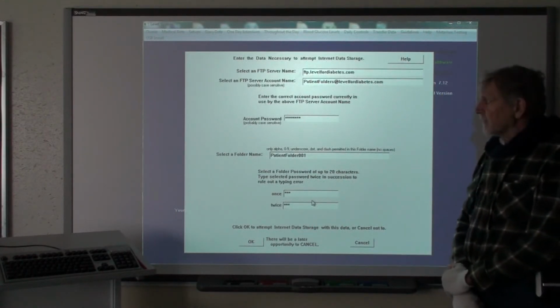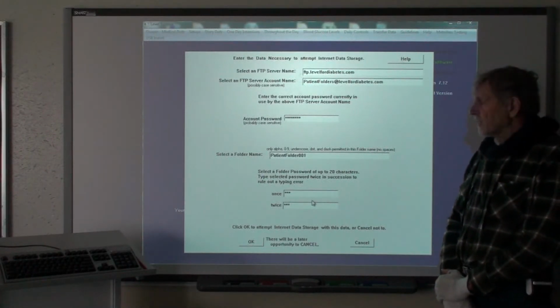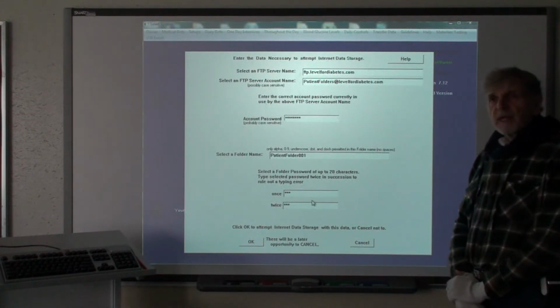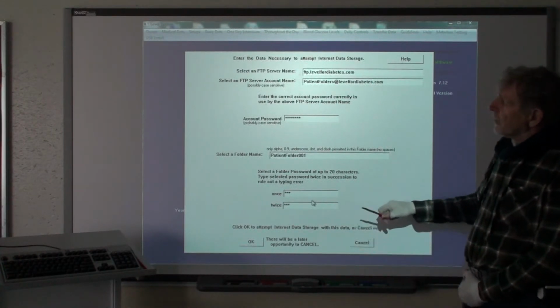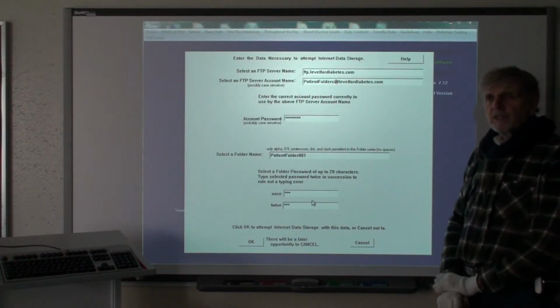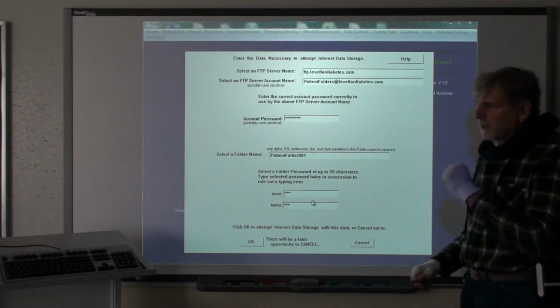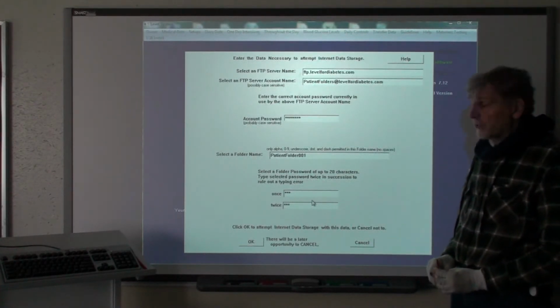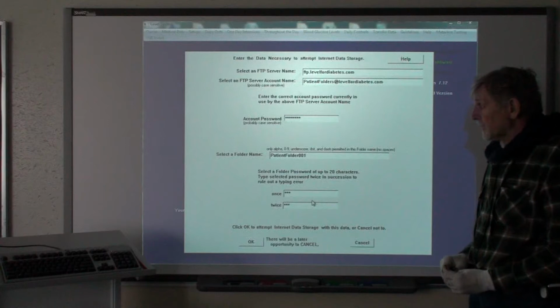Then your diabetes caregiver can also connect to this location and have your data made visible to them. If you want to install Level on another computer for yourself to use, such as your laptop, then on that other computer you also come to this screen and repeat the same information. So for as many computers as you care to install Level on for your private use, you would connect each of them to the same FTP storage location via this screen, and then each one of them would have access to that same data site.